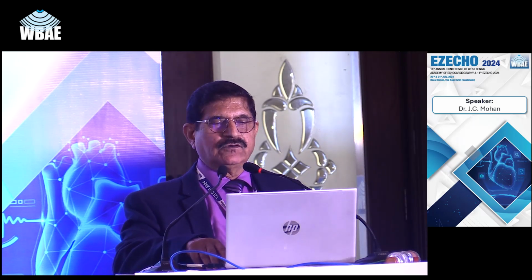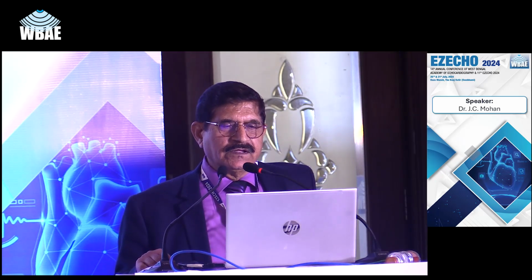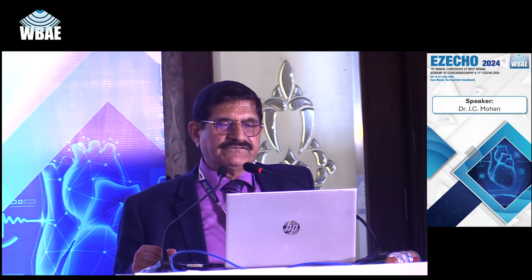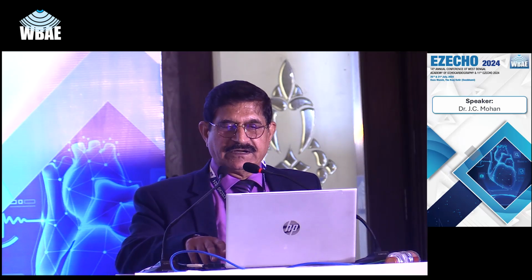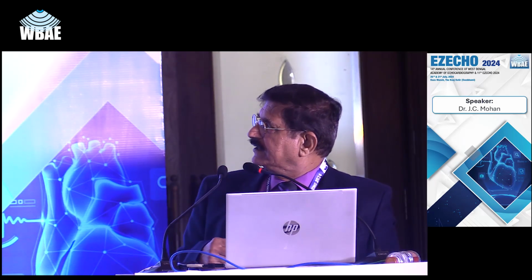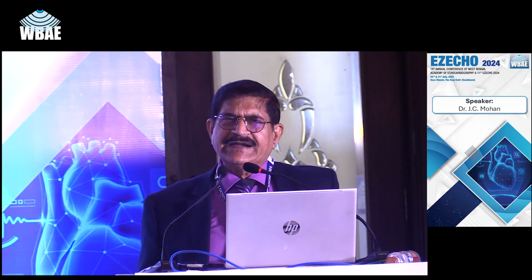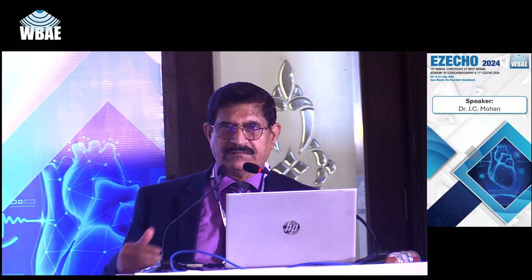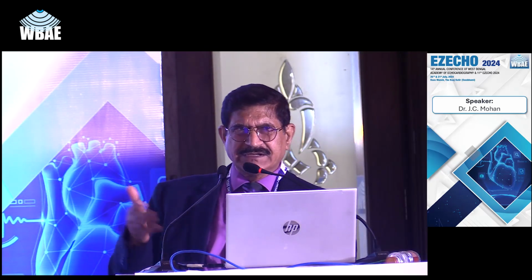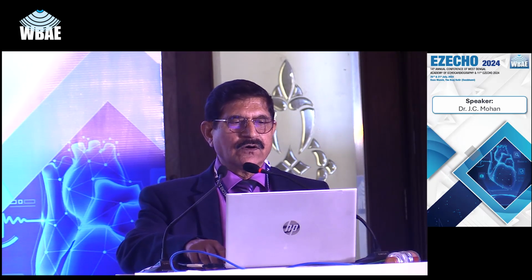And in the sagittal view also, you would see that the left atrium is enlarged, the aorta is coming, and then of course the coronary arteries, and this is the left ventricle outflow tract coming, and the left ventricle. Then you see the left ventricle in long and then short axis view and left ventricle hypertrophy. You do also see some pericardial fat. That yellow is pericardial fat at the top, at the bottom of course the pericardial effusion. The fat has very negative Hounsfield units, more like -50 to -100, so it looks absolutely black, while the pericardial effusion has more like 0, 10, 20, so it looks lesser than the myocardium, so you have pericardial effusion.